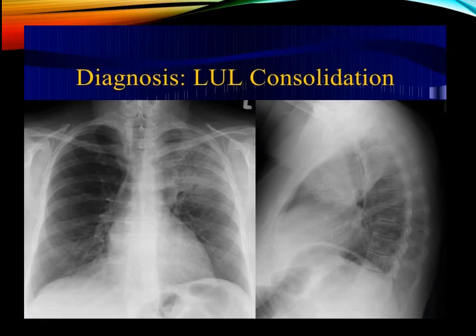In this chest X-ray we notice that the left lung is more opaque than the right lung. Also the red arrow points to a tubular translucency, representing the presence of an air bronchogram. After we diagnosed that we have a patchy opacification, because it is an ill-defined opacity in the left lung, we should look for signs of loss of volume. As you notice, the trachea is central, the mediastinum is central, and the left diaphragm is not elevated, so we do not have any signs of loss of volume. So we are dealing with a patchy opacification due to consolidation.